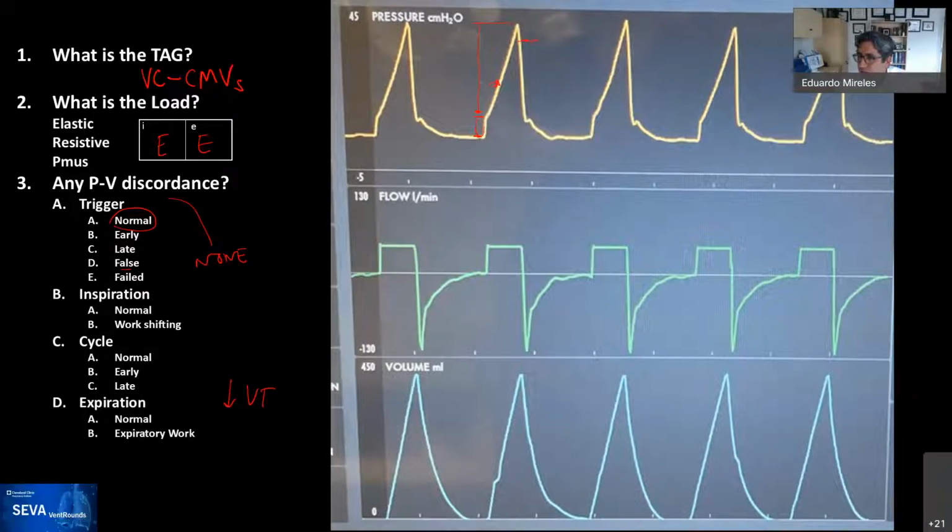So Miguel Ibarra asks, is it justified to diagnose a high stress index according to the pressure time curve? Both are great questions. There's also another question from Dilip asking about the respiratory rate, and it's close to 30. So if this is 1 second, he's getting around 30. I think he was at 36 breaths per minute on this one.